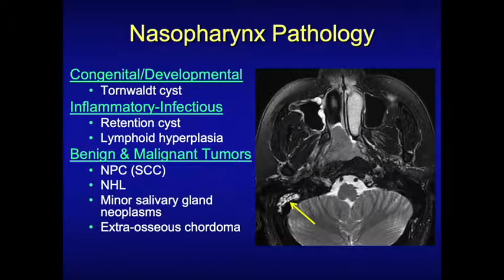This is just a classic example of a nasopharyngeal mass. If you ever see fluid in the mastoid air cells, and I want you to notice this on every case, whether it's a head CT for headache, or a sinus CT, or a brain MRI for altered mental status, you always want to look at the nasopharyngeal mucosa, look at that lateral pharyngeal recess, that fossa of Rosenmuller, to see if there's a tumor, because you can help diagnose tumors early this way. This is an obvious large tumor of the nasopharynx with extension anteriorly into the nasal cavity.